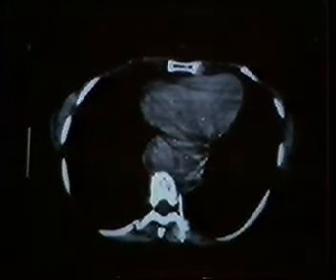So I don't think we've covered everything, but I think the common ones are the ones we've listed, and even Castleman's is not all that common. Here's a middle mediastinal mass. Bolus intravenous contrast clearly shows a lot of enhancement, and this was proven to represent Castleman disease.